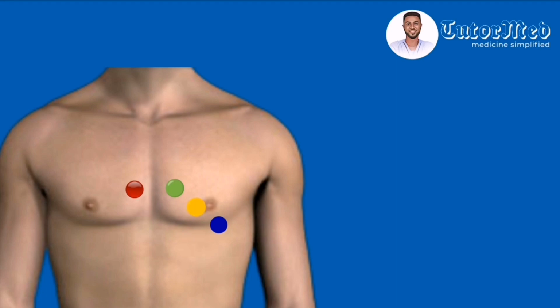Now medically, the armpit of the patient is known as the axilla. And so we put the 5th electrode on the anterior axillary line in the 5th intercostal space on the left. And then the 6th electrode in the mid-axillary line, also in the 5th intercostal space on the left. Now this diagram appears as though the 6th electrode is put on the arm, but actually it's in the mid-axillary line. And so 6 electrodes on the chest, but we are interested in leads, not electrodes.